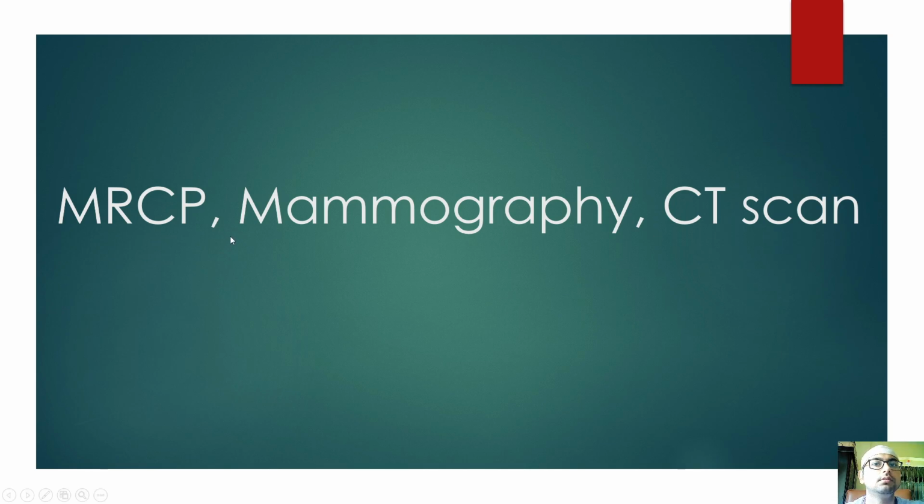Okay, now the rest of the imaging part is MRCP, mammogram, and CT scan. Okay, sometimes there's a CT film, MRCP film, some report. They will give you the reports, and you have to make a report. Okay.